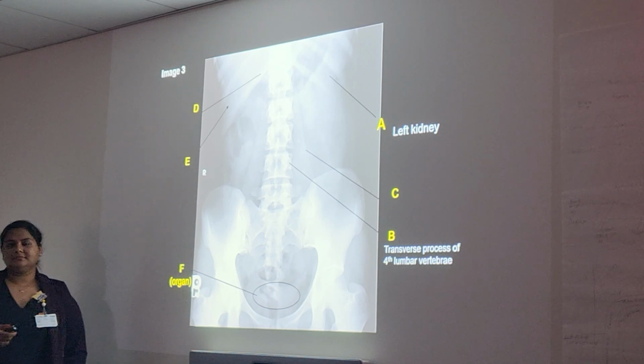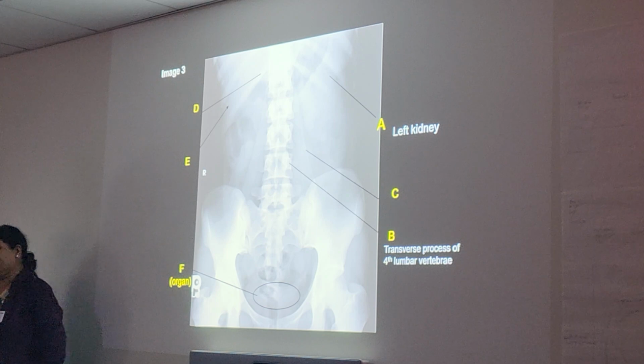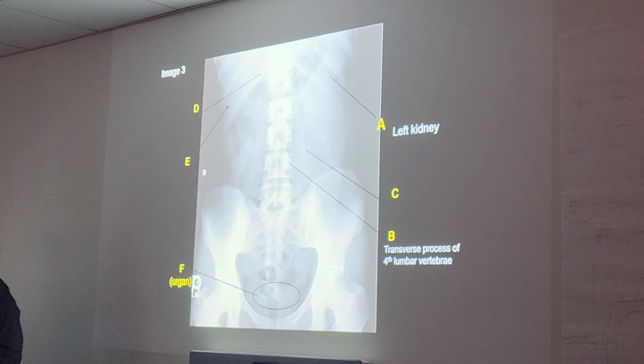So then, would we be able to see the superimposed pedicle here, or where would we be able to see it? The pedicles are over here on the inside of the spine. So that would be the wing, yeah. I should have put the arrow up over here. It's okay. My bad. It's okay. You're still teaching the semester.